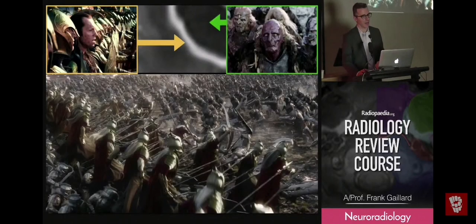So let's have a look at an abscess. And the important thing to understand about an abscess is that physiologically, it's a fundamentally different process to a glioblastoma or a metastasis, where the enhancement is the pathology in the latter two. Whereas in an abscess, the enhancement is the defence. That's your brain trying to keep the pus contained. And so it's a physiological, organised response all the way around the invading horde. And that pattern is what helps you to distinguish abscesses from the other two entities on the grounds of enhancement.